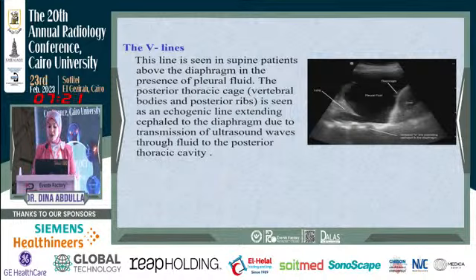However, if the artifact is superficial to the pleural line, it means that it's in the chest wall, and it occurs when there is surgical emphysema, like in E-lines or W-lines, surgical emphysema or subcutaneous metallic artifact, bullets, shotguns, or whatever.